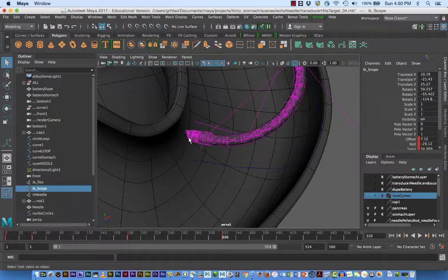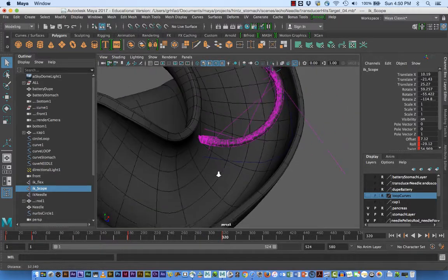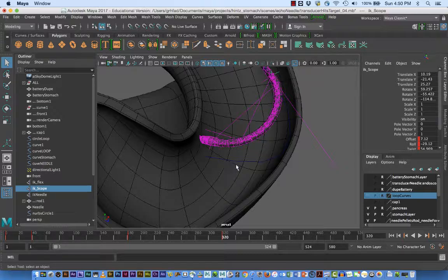Now, I'm inside the wall of the stomach a little bit. I'm not going to worry about that right now because I'm going to use another technique later. But what I want to do is pretend they're controlling this scope going up and down along that wall, trying to use the sonographic image to judge where they are relative to that tumor. So my tumor is behind the wall of the stomach. It's in here. And actually what I would do is put a little bit of the tumor right above so it can make it easier for the learner to understand.